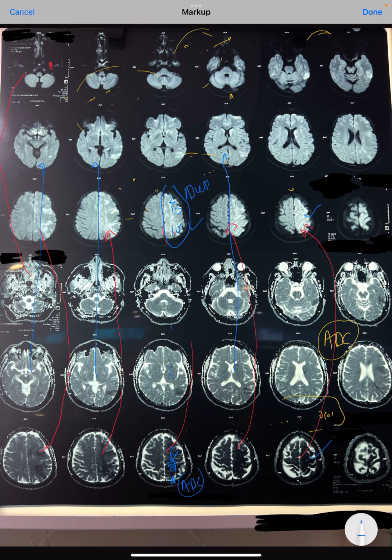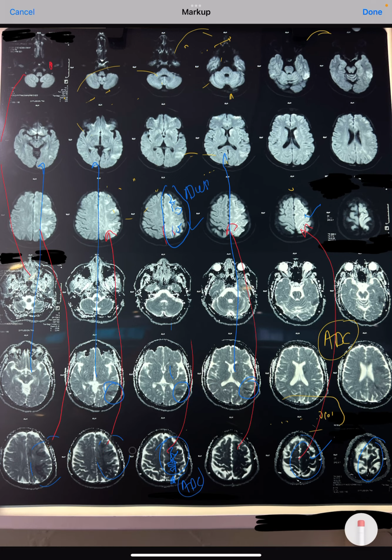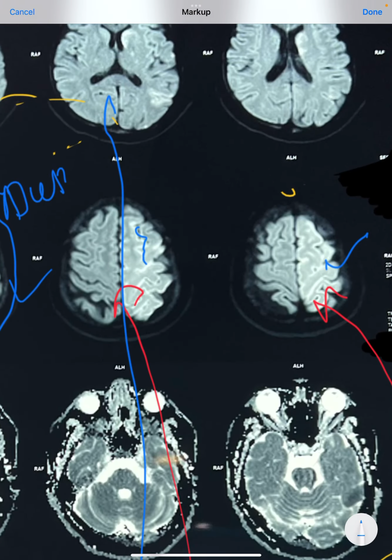So the blackishness is here, and it is patchy in this area. So there is patchiness. So this corresponds to all acute infarct, and we can very easily see in here that this dense white is all acute infarct.